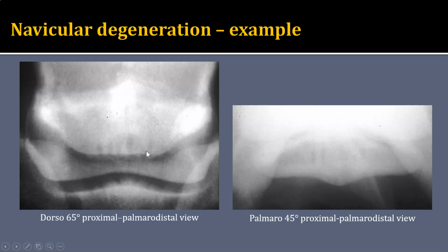Sometimes you'll see 5 or fewer in the normal patient. So if you start to see more than that, that is potentially of concern. And if you see them going out towards the extremities, that can be of concern as well. This patient also has a finding of sclerosis of the medullary cavity here, so a lot of increase in that bone opacity, causing loss of the medullary and cortical distinction or definition. There is some artifact from packing that is superimposed over the navicular bone, extending beyond it, so we always have to be careful not to overinterpret that.